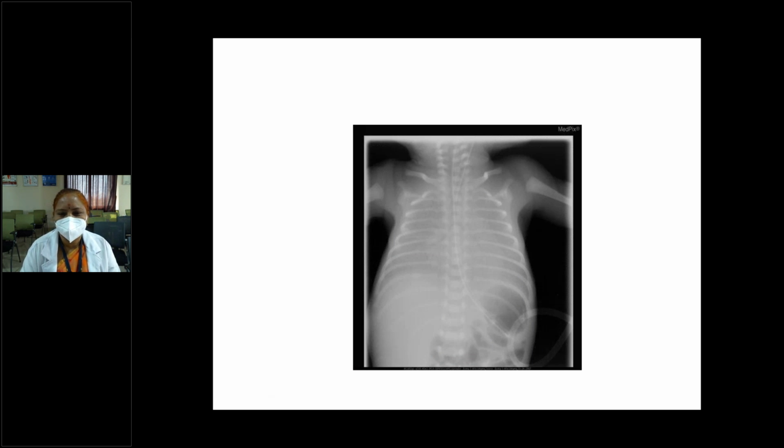Next, this X-ray. It's a plain X-ray of anteroposterior view showing the thorax and the upper part of the abdomen. The lungs are not clearly visible, ma'am. Both the lungs and cardiac margins are also not visible clearly. So how is it looking?